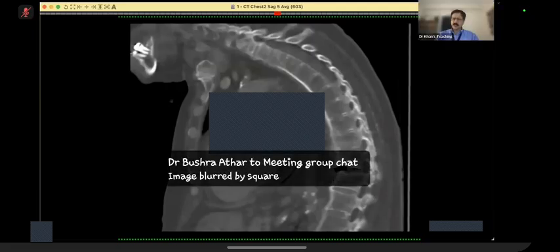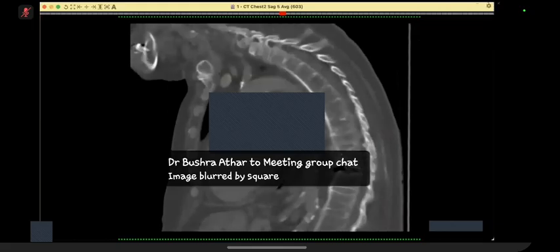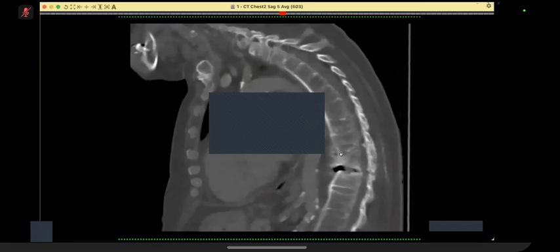Where is the fracture in the body of the vertebra? This is what you told me, correct? Yes, I think it is within the body. Where you are pointing out? Yes, over here also I think this intervertebral disc transection of the anterior longitudinal ligament could also mean that there is a carrot stick fracture in ankylosing spondylitis. Okay, thank you.